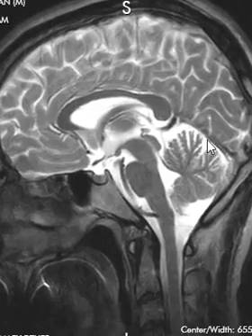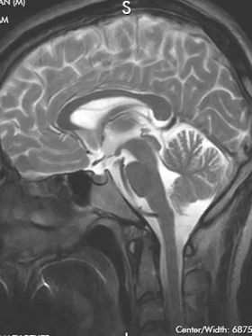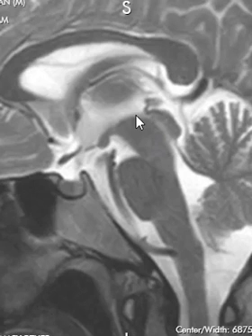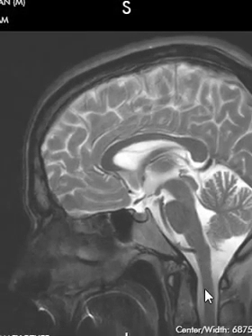Now down below we have something in back here. This is called the cerebellum. The cerebellum looks like cauliflower here. And also we have some structures here in the middle. These middle structures are the midbrain and the brain stem. So the midbrain is in this region over here, and then the brain stem is this area here. This is the pons, which is this ovoid area, and the medulla is more of a straight area. And then if we go down here, we can see the spinal cord that goes down through the neck, comes off the bottom of the brain stem. This is the cervical spine down here.